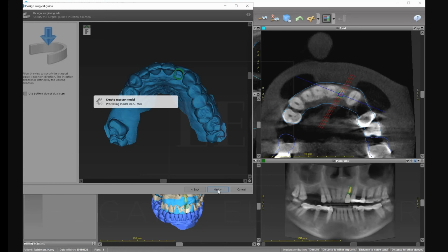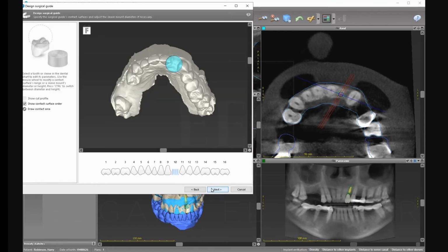Do you always want it edge to edge, the bite? No, the bite here, in this case, is edge to edge, just because that patient is like that. I mean, this is doing it for my resident, but nevertheless, I want you to see what I can do. Slowly you will learn. You can prepare that for me.